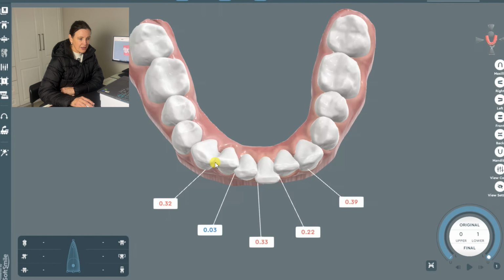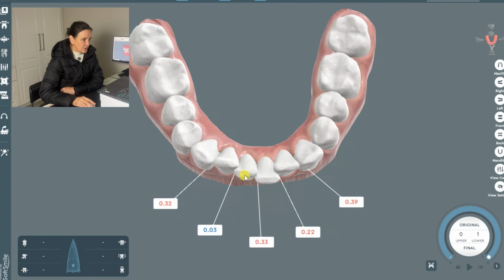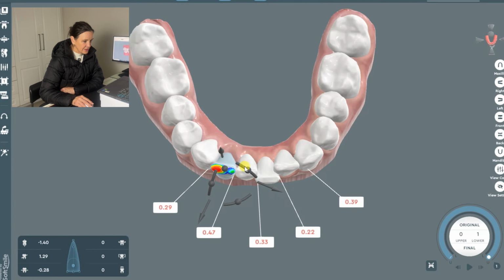And then I'm going to actually increase the overjet massively. And this patient at this stage is not aware of the overjet. She's not complaining of it. But if you increase it and the lip catches behind it, be aware, she may come back and then she wants to be retreated, or she's not a happy patient and is not happy for your practice. So never increase an overbite. The patients don't like that. Actually, it's an overjet, not an overbite. So let's see. If we use the 4-1 as our tooth of reference and we want to get all the other teeth in line there, let's see.